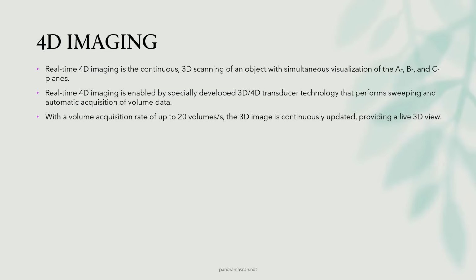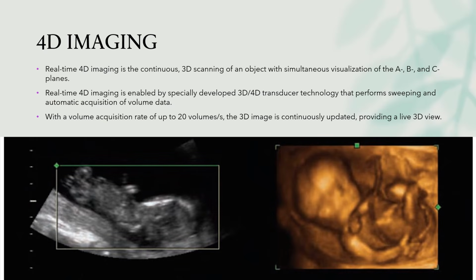These transducers capture up to 20 volumes per second, ensuring that the 3D image is constantly updated and providing a live 3D view. This continuous flow of data enables real-time observations and is crucial for visualizing complex fetal structures or dynamic movements during an ultrasound examination.